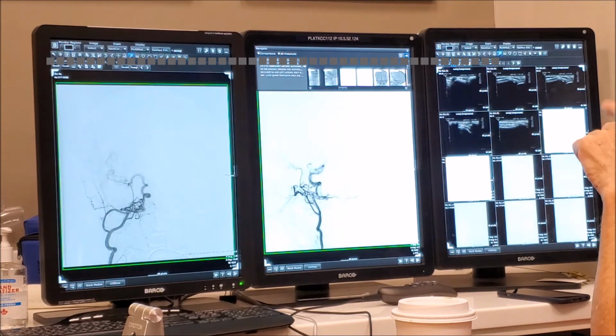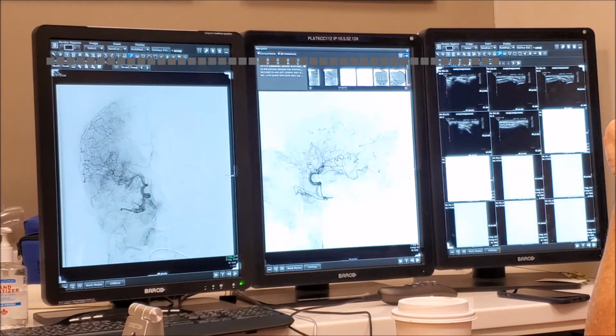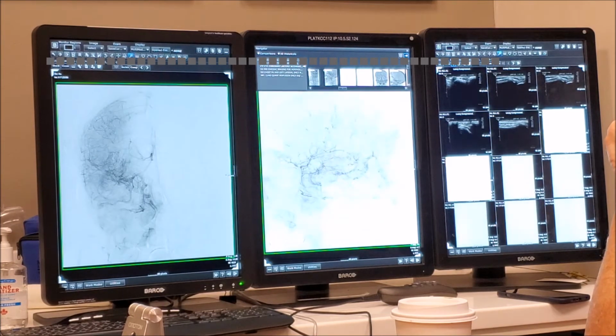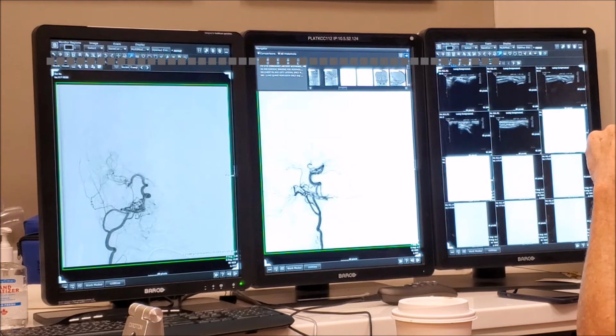Now, if we go to the CAT scan, let's look for a foramen spinosum. Maybe there is no foramen spinosum. One second. There's the retinal blush, right? Yes. So then the ophthalmic artery is coming from here. Meningolacrimal. And this meningolacrimal is a branch of the MMA? This is a very typical curve for meningolacrimal. So this is a branch of the MMA? It's being supplied by, we can't resolve it that well here, but I think yes, I think it's the middle meningeal artery.